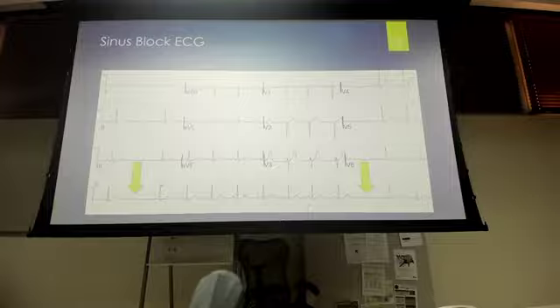But here, when you march these out for a sinus block, it marches out right on point. Here, you should have an R wave here, and then your R wave here marches right out. If this was an escape rhythm only, we would have our cycle here that's missed, and then your escape rhythm is going to start right after that, not march out in alignment like we have here. Okay, so we march all these out. Here we should have a QRS complex here. We didn't. But then the body recognized that, picked it back up, right in alignment, started beating again.